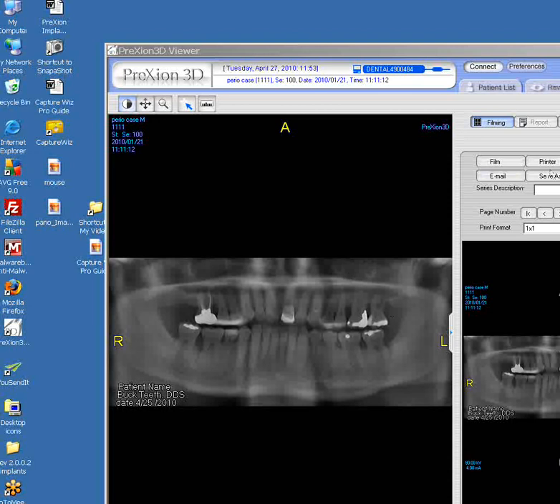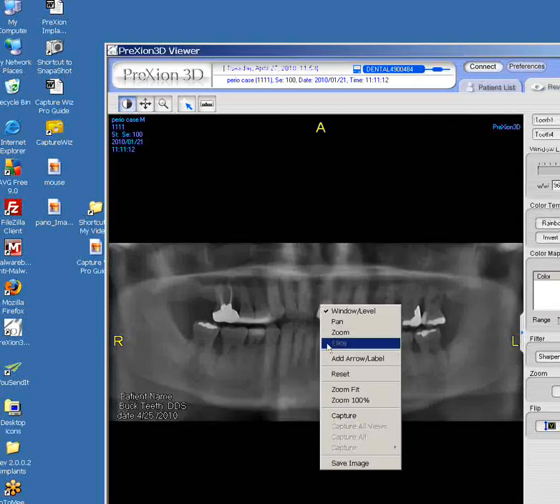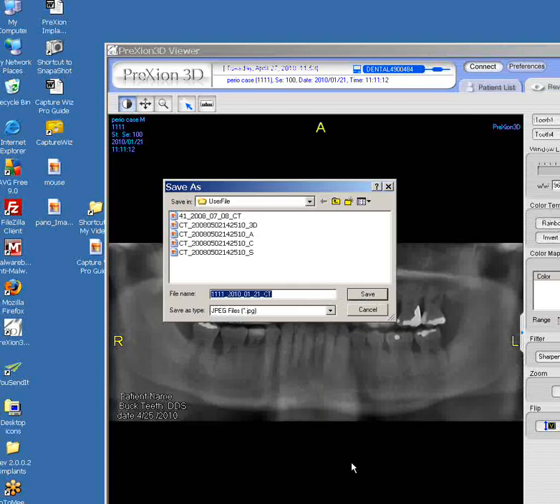They could simply go back to review mode here and simply right click it and then hit save image, and then you could save it to a particular file again. Just rename this as we did before, and then save it to a file, and then one can recall it later. And this is to benefit if they wish to crop it. And I'll demonstrate this here, how to crop.